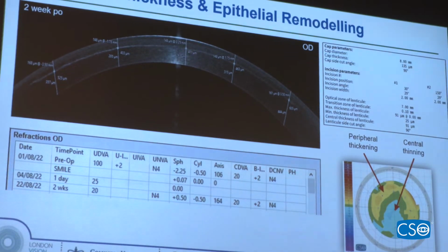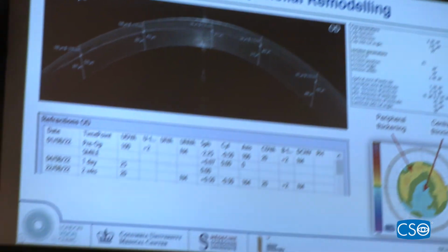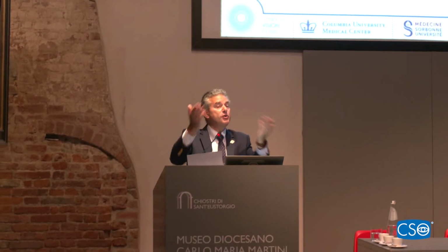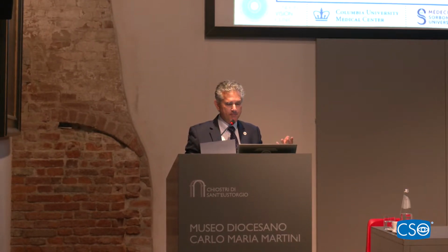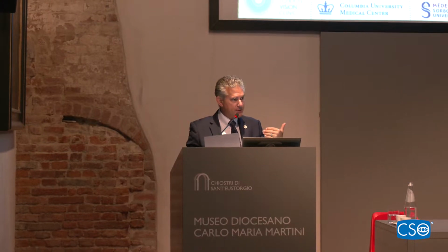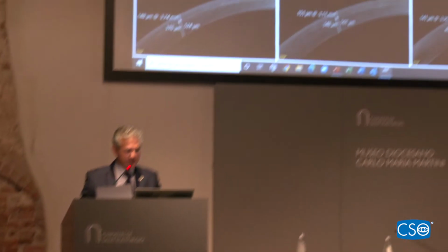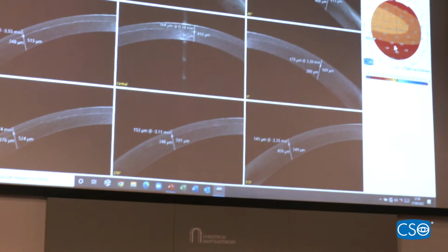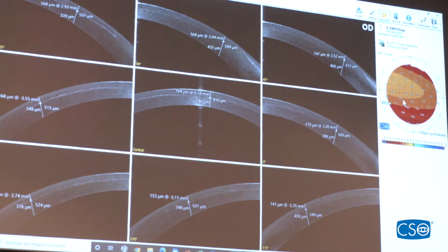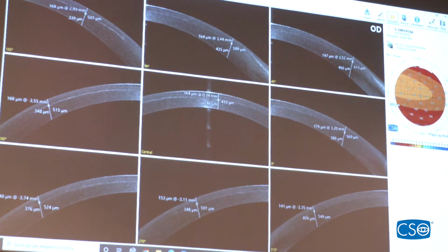You can only know what happened at the time if you get the stromal component of the flap post-op and add the pre-op epithelium to it. Then you know what the flap or cap was. This is the way that we program flaps over caps. We need to know what the minimum or maximum thickness is, so that we can make sure that we program a flap on top and that it's not going to cross into the interface, okay?